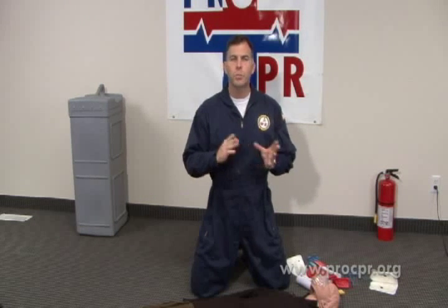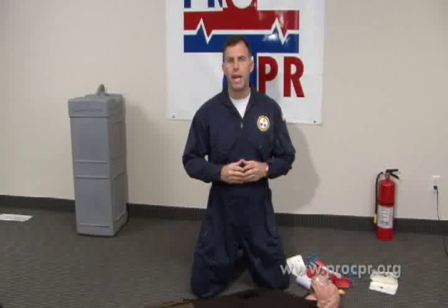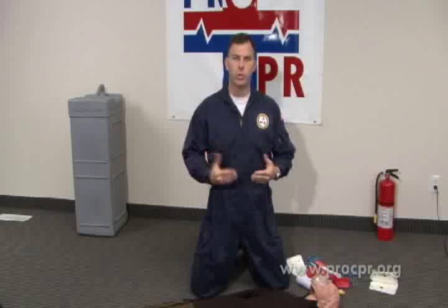In this segment, we're going to be covering AEDs. There's been some changes since 2002, and we're going to be going over some of those new 2005 guidelines and how they apply to you, the rescuer.